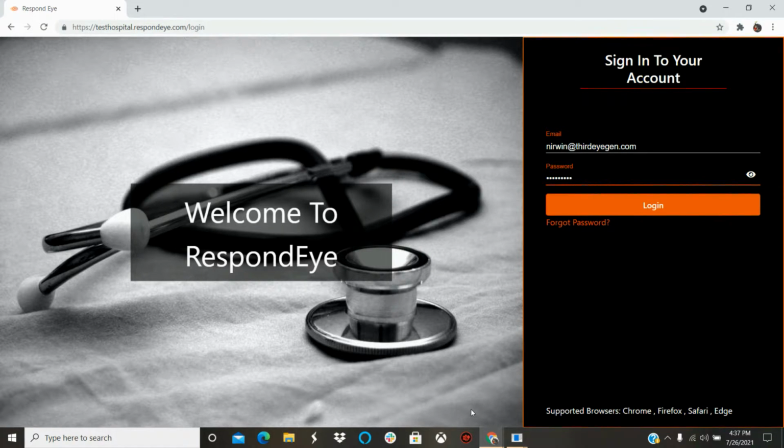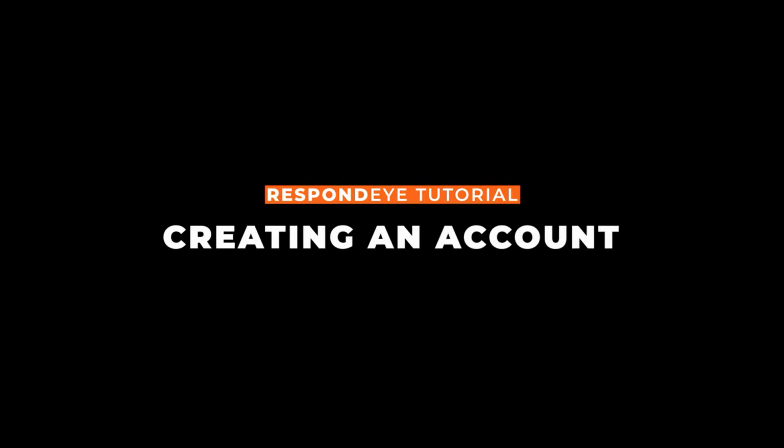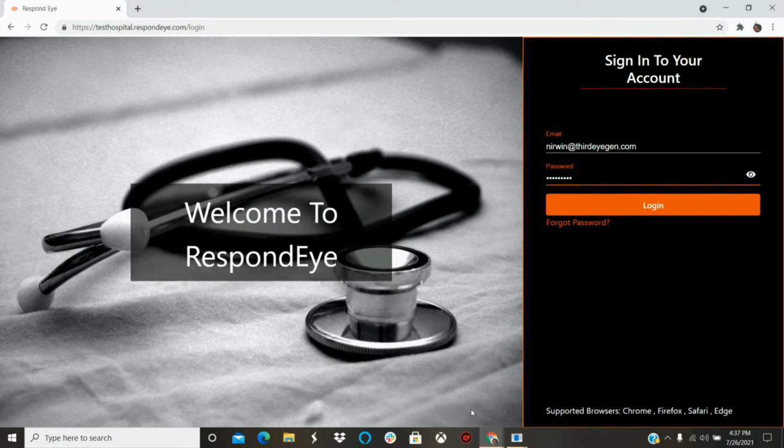Today, I will be teaching you how to sign up for our RespondEye platform, while also showing you how to use various tools within the software. How to sign up and make an account.